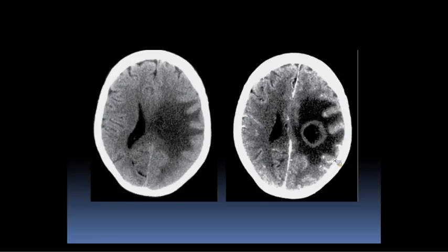And this comes up for us every couple of weeks. We'll get a case that is a rule-out stroke, an acute stroke protocol, and it looks like a vasogenic edema pattern, and so we recommend an MRI, and we say it's not a stroke.